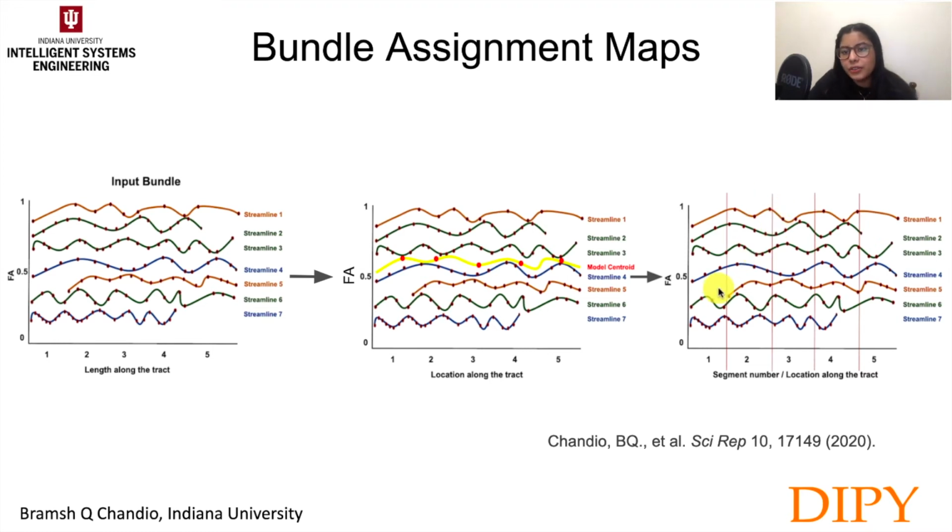So we are not reordering data or resampling data or doing anything at all. We just keep the data as it is. We just give it an extra label. You can think of it as a soft assignment where we just give a label to it. And here is the visualization of how it works. All the points that are near centroid 1 will belong to this one segment. Here I've just created those lines to show the segments.